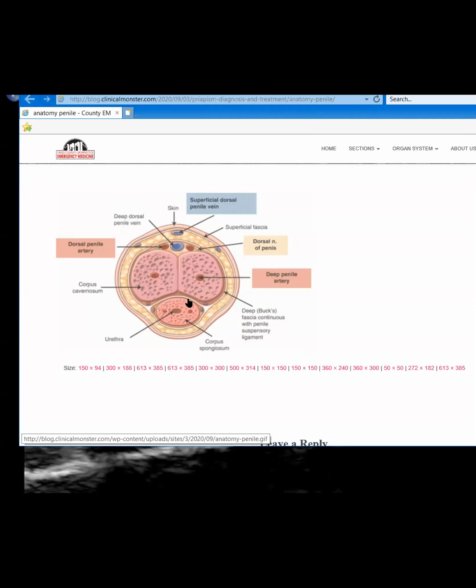deep. One of the differentials for penile fracture is thrombosis of these deep veins. The only clinically differentiating factor is when there is thrombosis, the presentation is acute, but patients with penile fractures tend to present with a deformity, whereas those with spontaneous thrombosis may not have that deformity. So I just thought this was like a classic textbook picture of a nice ultrasound case of penile fracture.